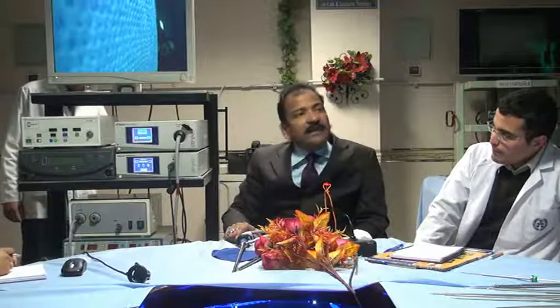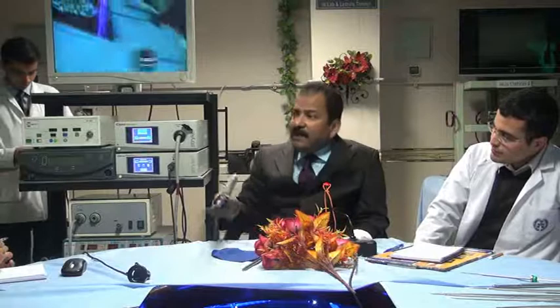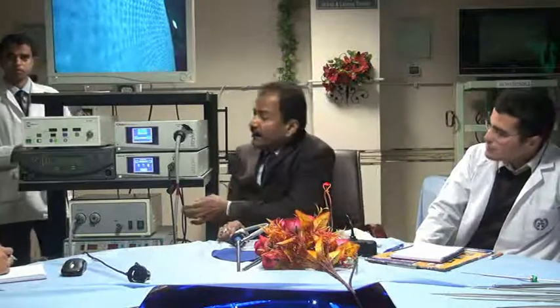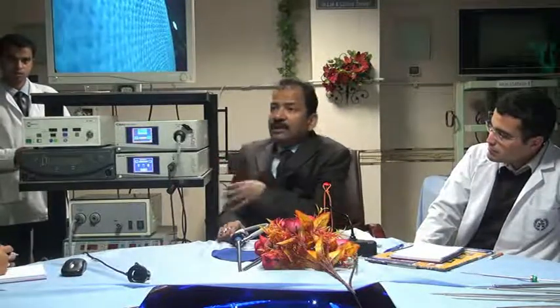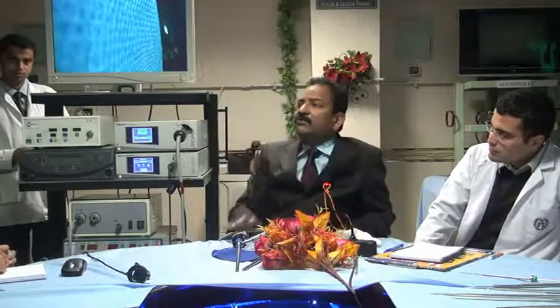It should be done one time only, just before entering the abdomen. And it can be done a second time if the power is switched off during the surgery, then memory is lost. Or accidentally if you have used some blood or betadine to clean, or you think that the color is not coming good, take it out and again do it on the white. Or if the light source or light cable is changed, any optical chain is changed, camera is changed, monitor is changed, then you can do the white balance.